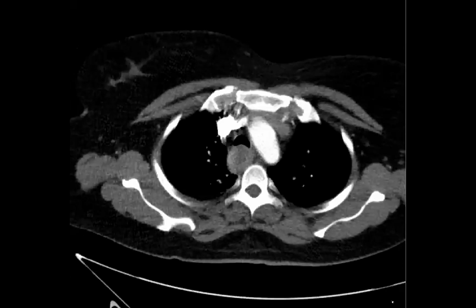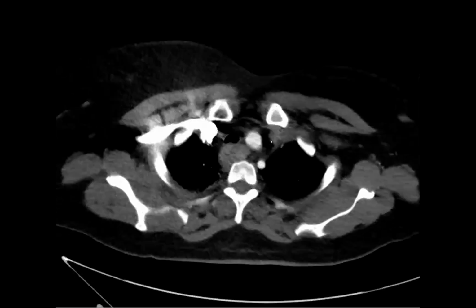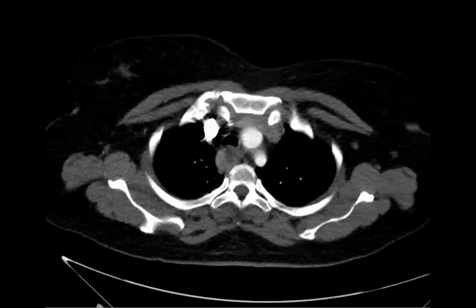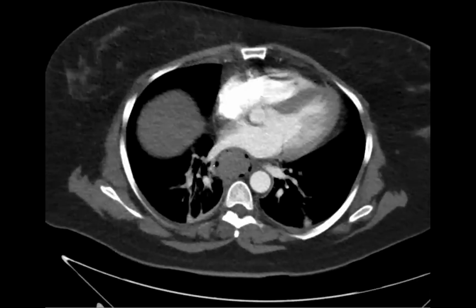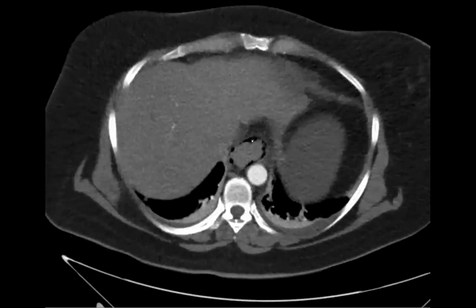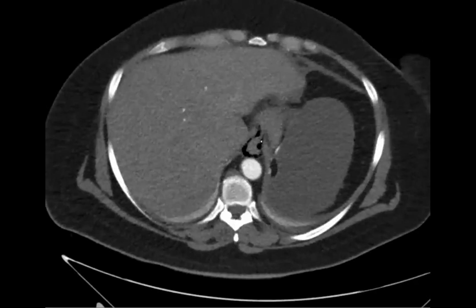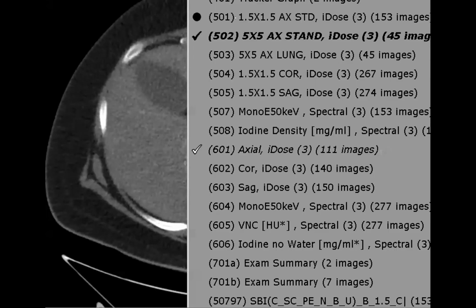So these are just several interesting cases. This was a young woman who had Roux-en-Y gastric bypass and was sick afterwards. And this is something that I've never seen before: pneumatosis of the esophagus. You can see that the esophagus is dilated, filled with debris, and there's clearly pneumatosis.